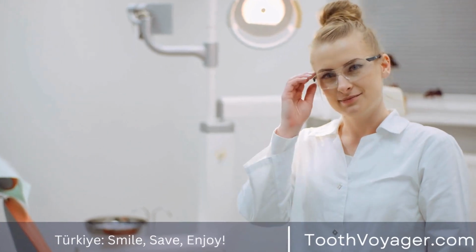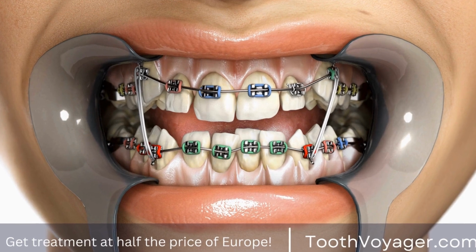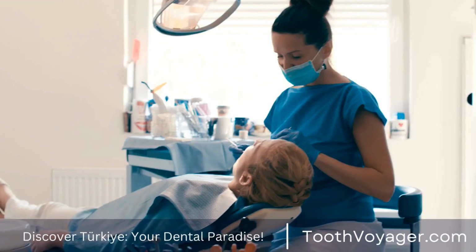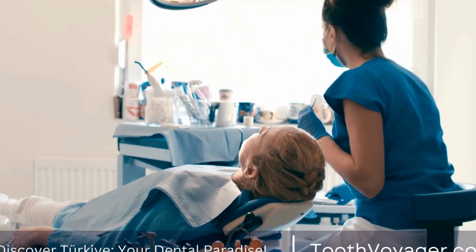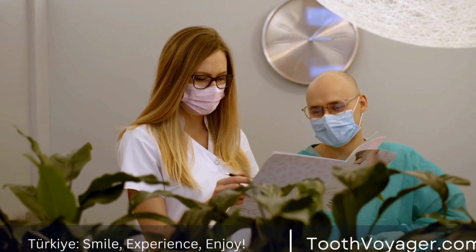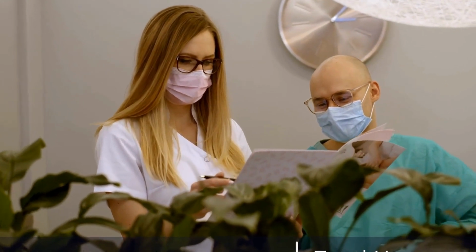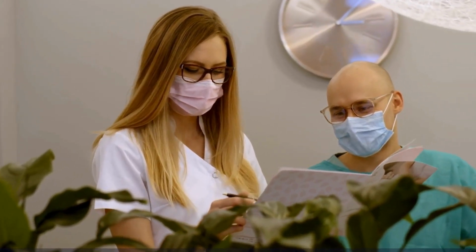Denture creation is a vital method in dentistry. It involves creating custom-made prosthetics in order to provide the best ease for the patient. Dentures are removable substitutes for missing teeth, as well as the adjacent tissues. They serve a crucial role in the restoration of oral function as well as appearance for those who've lost their teeth as a result of diverse reasons, such as tooth damage, decay, or even aging.